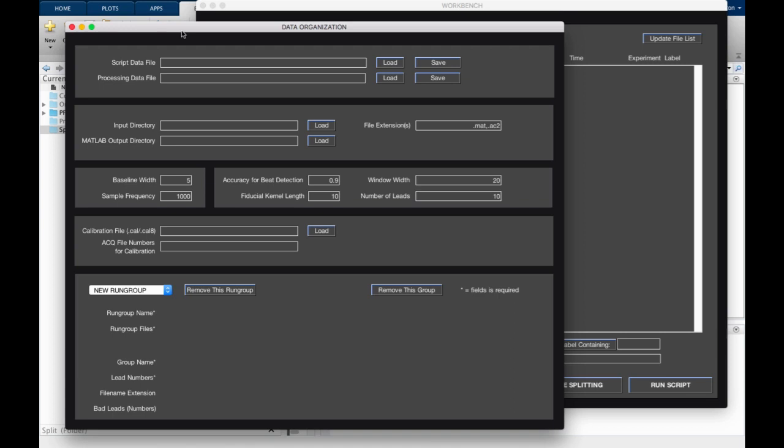Pfeifer stands for a preprocessing framework for electrograms intermittently fiducialized from experimental recordings. For this tutorial, we are going to process experimental recordings from the Auckland Research Group that are stored on the EDGAR online repository, which can be found at edgar.sci.utah.edu. I am taking a 15-second recording of the potentials measured in a swine study, which has potentials simultaneously measured on the epicardium and the torso surface.